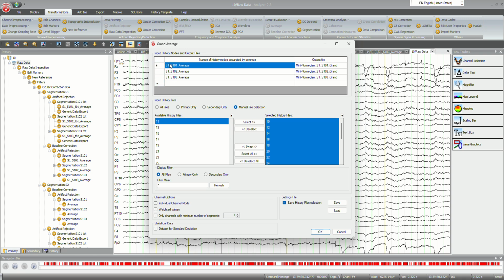So you can see here S1, which corresponds to gender agreement in our case, S101, which corresponds to the grammatical condition, the violation of interest condition, namely gender agreement violation, and the other one, which is number agreement violation. All right, these names are nodes that we already have in place.